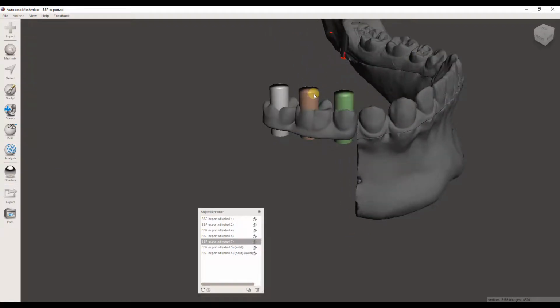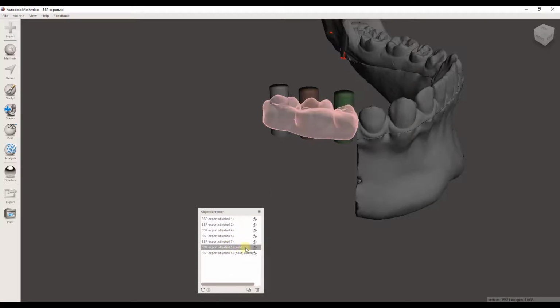So now I'm going to choose these abutments, and actually before I do that, I've got 2 of these. I'm going to get rid of this first thing that says solid that we were working with, because I just used the make solid function again to make this one. So this is the one we want to use for the next step. And so I'm going to delete that first one just so it's not confusing.